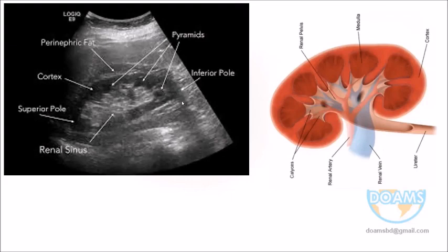So this picture is presented here by ultrasound. I don't know, do you understand the ultrasound or not? If you don't understand, ask me now. Look at this picture and match it with this ultrasound picture. In the cortical area it will be black.